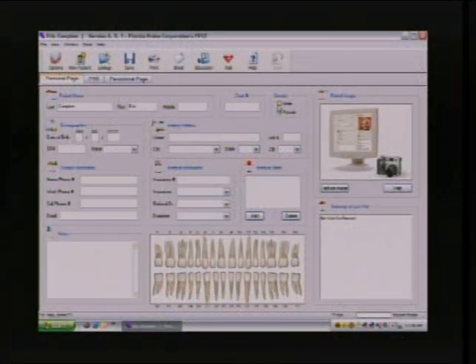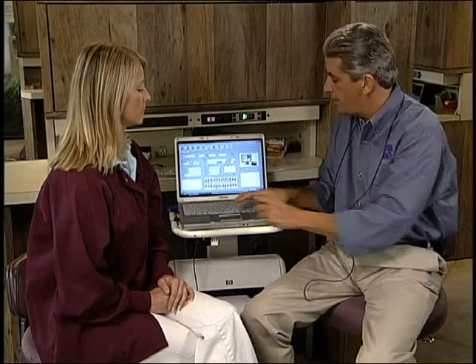And I will click on gender. Now, I'm going to use my date of birth because it's going to flow through to our periodontal risk assessment. So step one is simply to identify the patient. Launch Florida Probe and identify the patient.